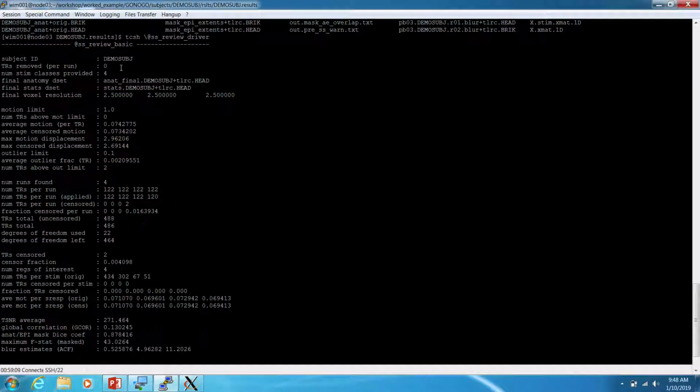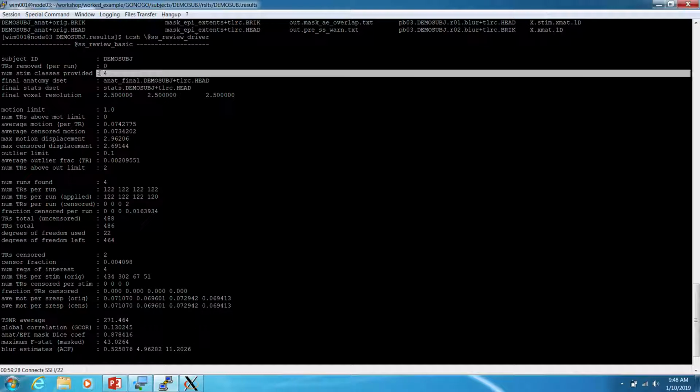So what you get is a report of how things went. It'll tell you the ID number, and there's a lot of information here. I'm going to highlight the key ones that are useful in evaluating things. It tells you how many types of stimuli you produced.